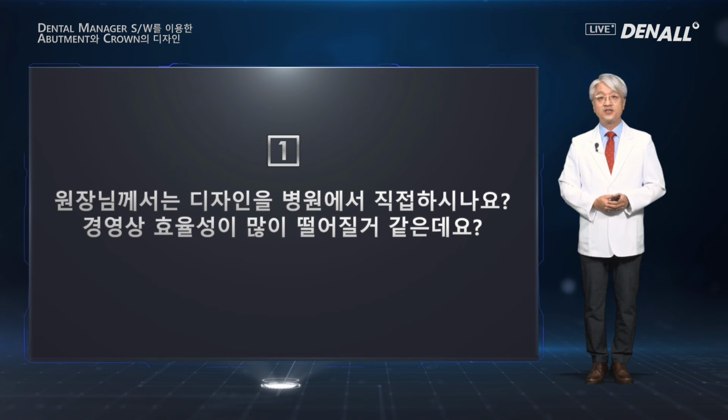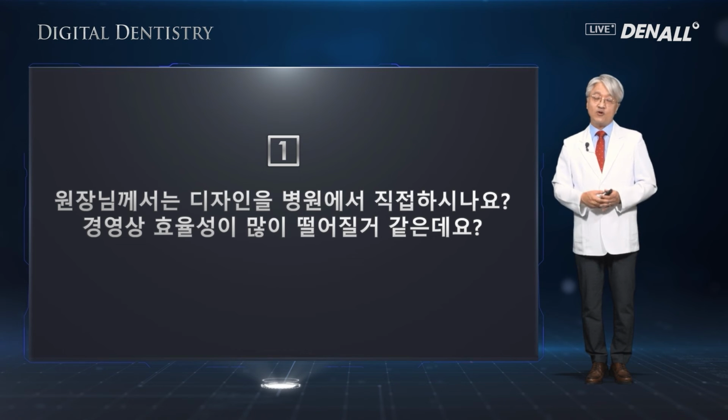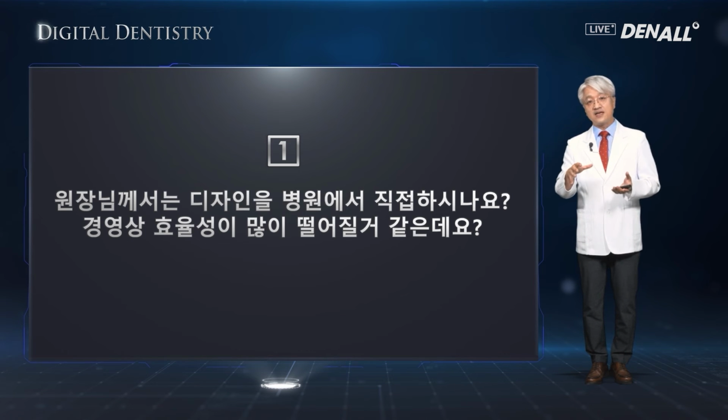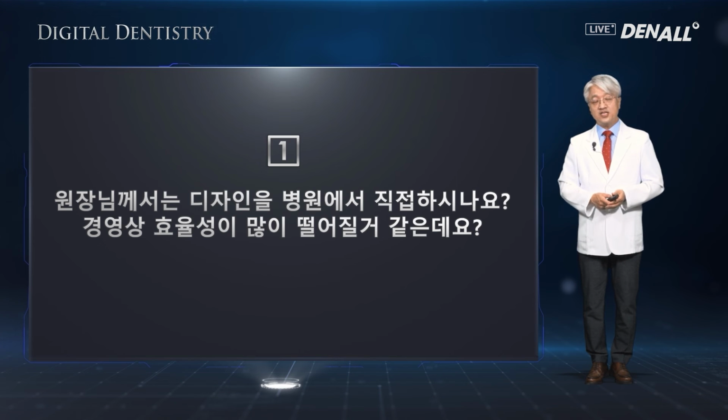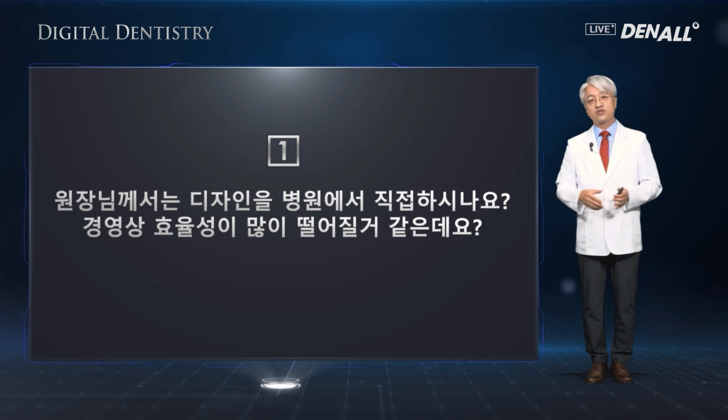Right now, we have a lab technician who is handling the designing to check each patient's unique occlusion or relation to adjacent teeth. The final confirmation is always made by me because when you see a patient, we need to consider so many things like occlusion status or the shape of an implant and the bone surrounding the implant, gingiva. So many things need to be considered for the design.